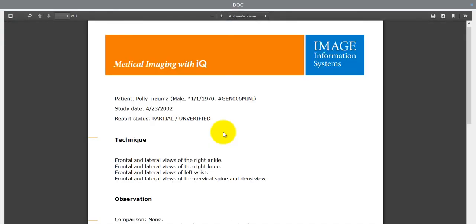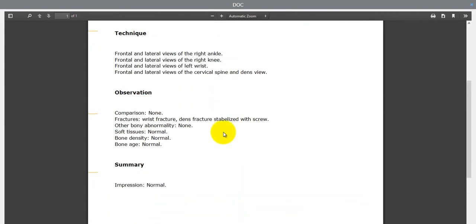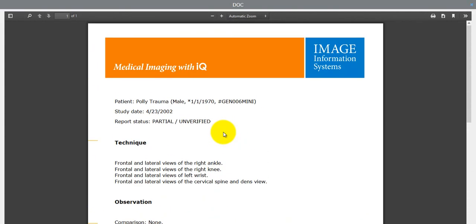Similarly, a DICOM structured report can be converted into an HL7 message to communicate the content with any HIS, RIS, or EMR. This concludes the tutorial video on reporting in iQ-4 Cloud 6.7.3 or iQ-4VIEW 2.2 using the redesigned report editor.